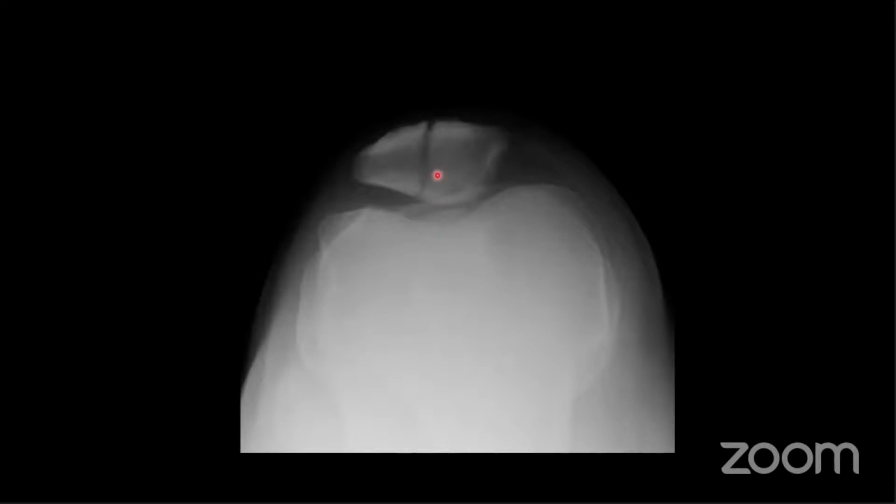I think we don't always do it. If you can, yeah, I agree, this would be very painful for the patient to do. If there was an obvious fracture, we probably wouldn't, as it would be difficult to get the knee into this position. But clearly they tolerated it, and we managed to get one. Patella fractures tend not to be particularly unstable, I don't think, because there's lots of muscle supporting them. So I think bending the knee wouldn't be particularly bad. I'm not an orthopedic surgeon, so I'm not entirely sure about that.